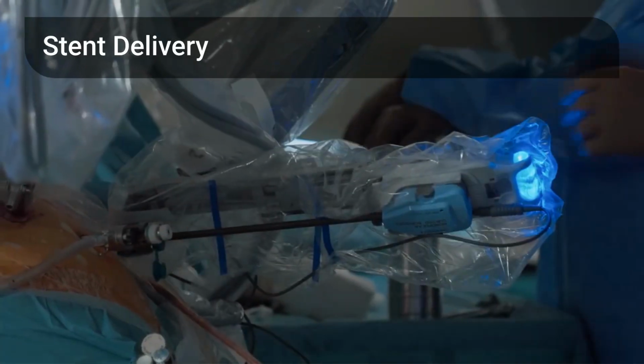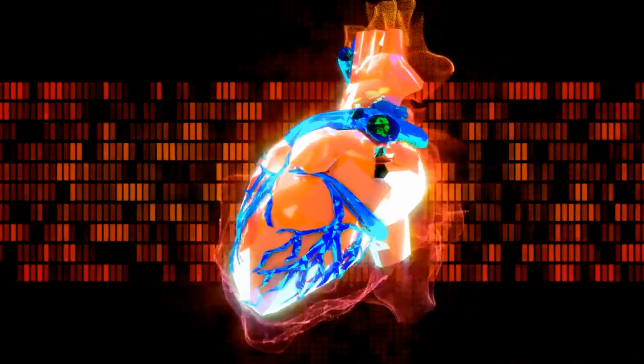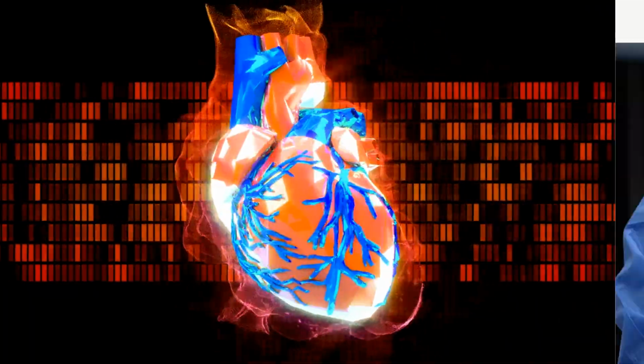Now, let's look at how the stent itself is delivered and deployed to maintain the opened artery. The stent is typically crimped onto another balloon catheter. This ensures precise delivery to the target area. Once positioned, the balloon is inflated, expanding the stent and pressing it firmly against the artery walls. The balloon is then deflated and removed, leaving the stent in place.